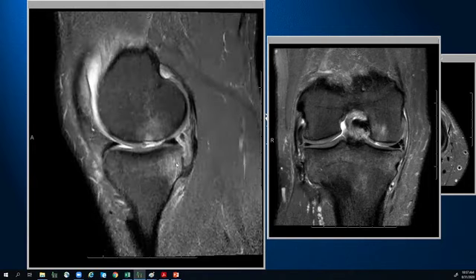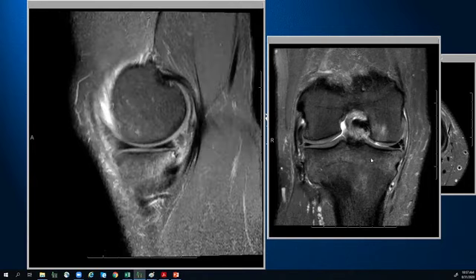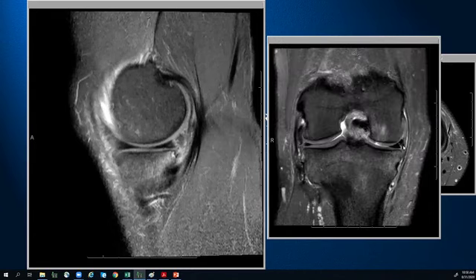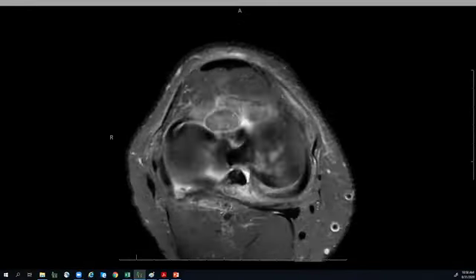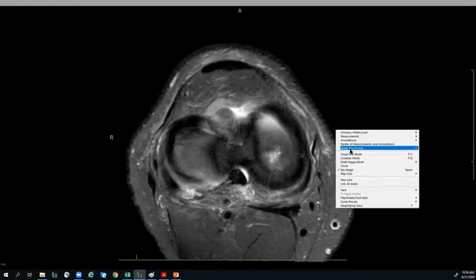And then when I go to the medial meniscus, we're seeing this vertically oriented tear, same distance from the outer margin of the meniscus. And as I'm following it on the coronal, it propagates forward, always staying the same distance from the outer meniscus. So it's at least involving the posterior horn and body of the medial meniscus. And when I line that up with the axial, it shouldn't surprise you that we're able to make out a good chunk of this vertical tear, paralleling the fibers of the C shape of the meniscus.